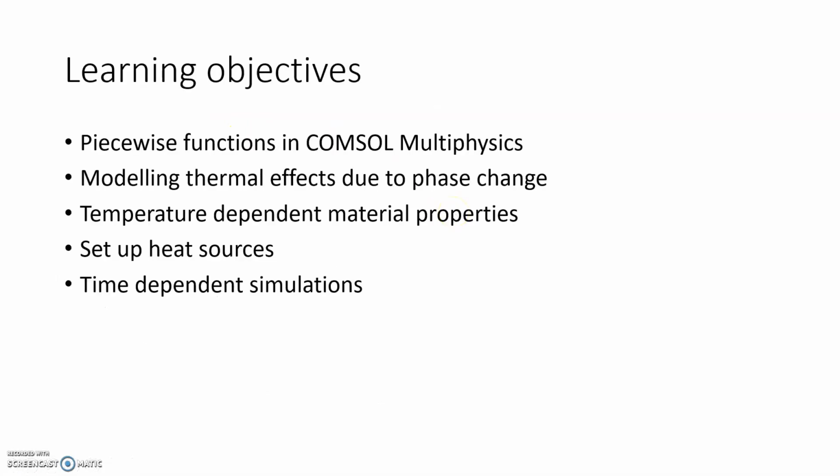The aim of this particular video is to show you how we can set up piecewise functions in COMSOL Multiphysics, and how we actually model thermal effects due to phase change without using the phase change module in COMSOL Multiphysics. We'll learn how to implement temperature-dependent material properties, how to set up heat sources, and we will be exploring time-dependent simulations.